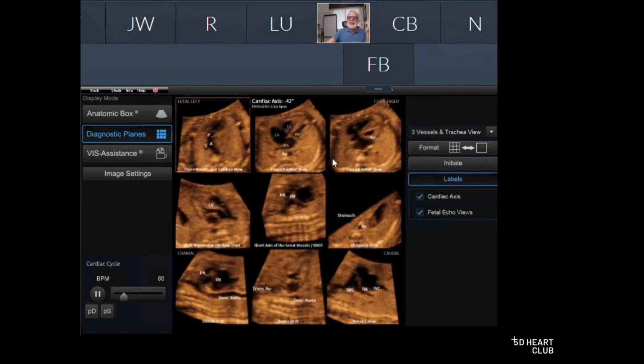Anyways, the beauty of the labels here is that you will see that they are confused. That's a sign that something is not good. Some will fit and some will not. And also because this patient has a situs problem, it makes things even worse.